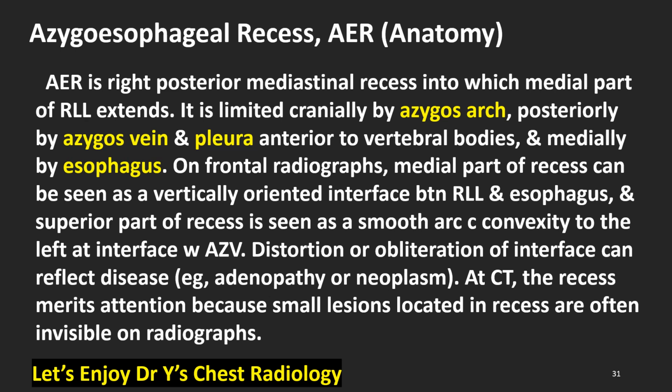Azygoesophageal recess. Anatomy. The azygoesophageal recess is a right posterior mediastinal recess into which the medial part of the right lower lobe extends. It is limited cranially by the azygos arch, posteriorly by the azygos vein and pleura anteriorly to vertebral bodies, and medially by the esophagus.